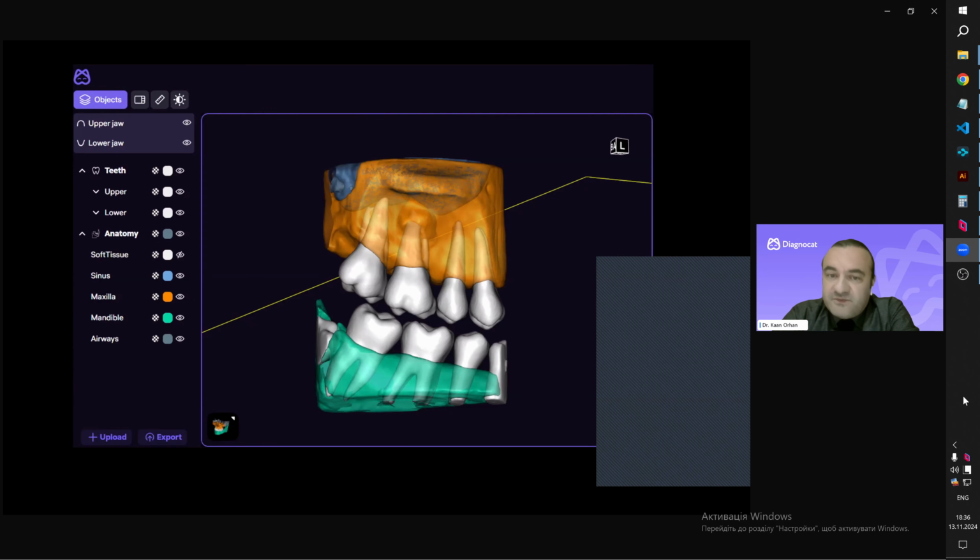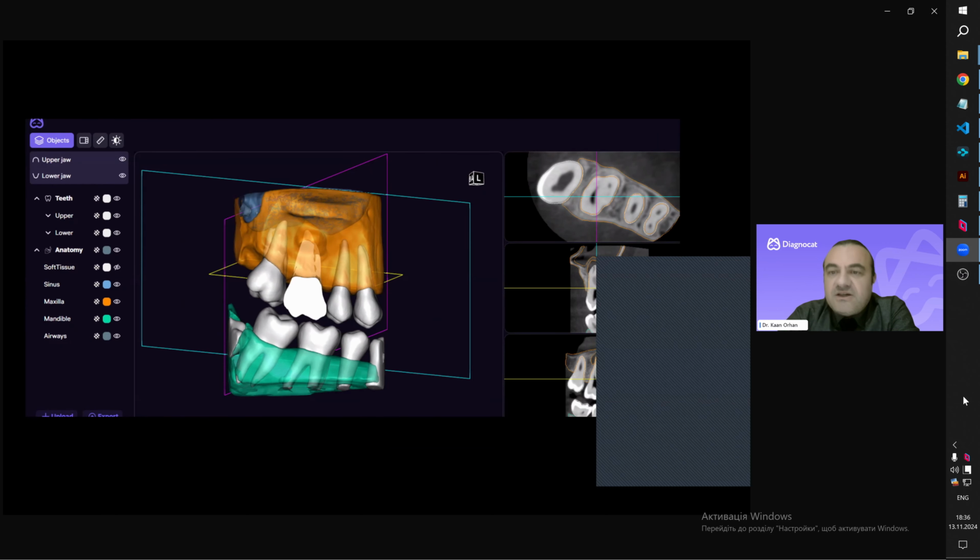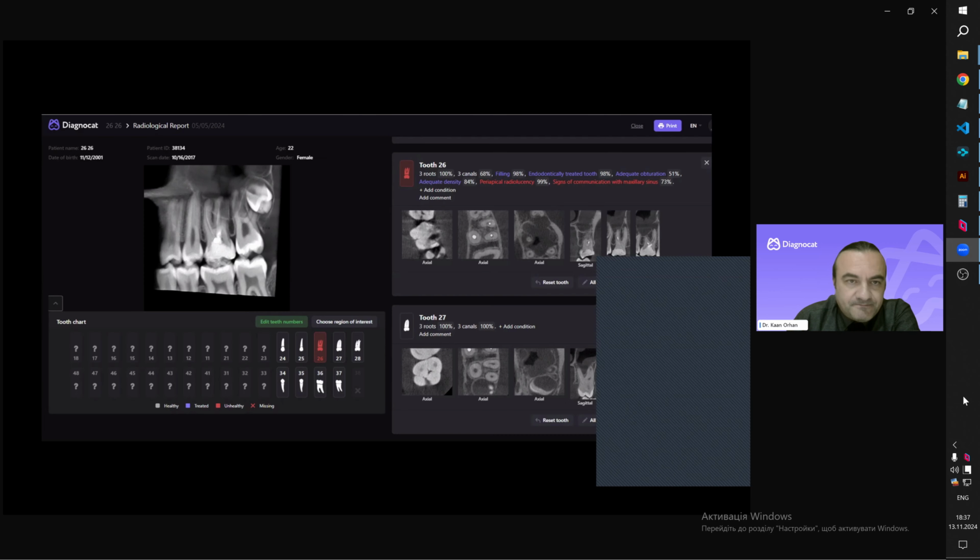Not just only from the slices, but see, we can nicely segment the periapical pathologies, and together using the threshold, we can see the relationship between the anatomy. As I already mentioned, we can not just see from the 3D, but also in an MPR view from axial, sagittal, and cross-sectional, and we can check the relationship, especially for this patient, between the maxillary sinus and the periapical pathology.